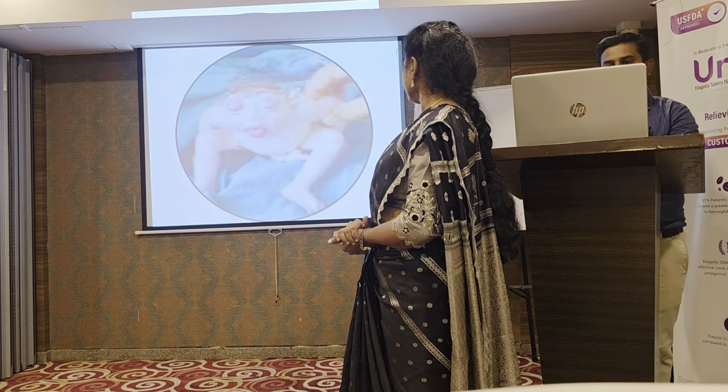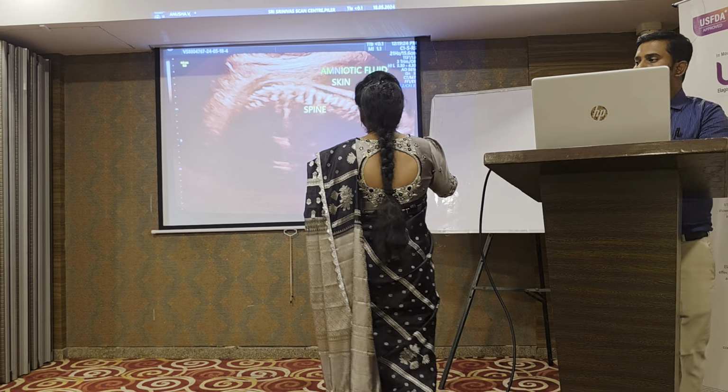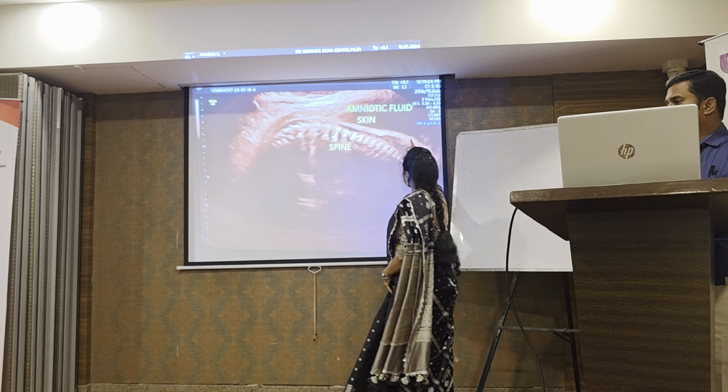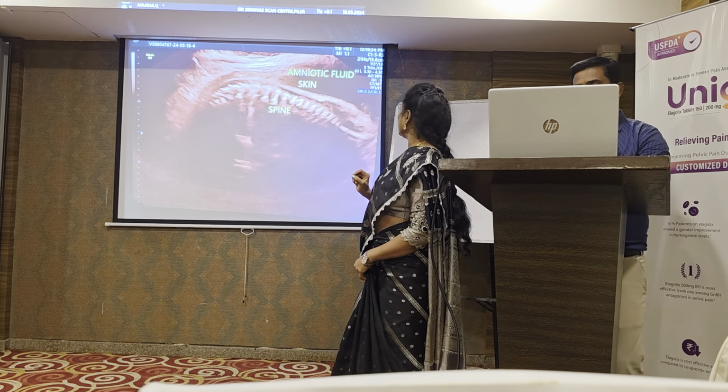Next one. Next one. So here again there is some problem with the upper portion of the spine also, along with occipital encephalocele. Next one.